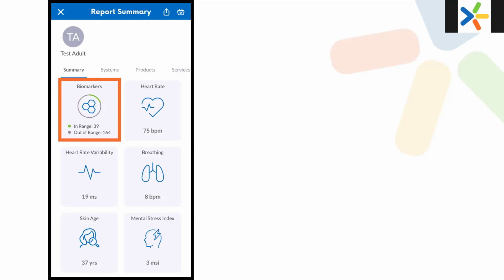So let's start talking about the different boxes. The way we're going to do this is we're going to start from the top and work our way down. I'll give you the information you need to know. Now remember, you're using this on your compatible smartphone or compatible iPad, so it's a touch screen. With all of these, if you ever touch any of these boxes, it'll open up a description or an explanation on that specific measurement in case you need a refresher on what that measurement is.